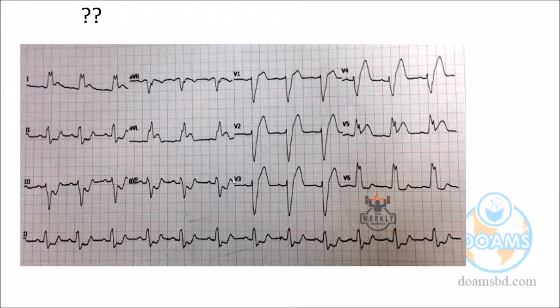So we are asking only about the block, and don't be busy with other diagnoses. What type of block, if any block, is here?